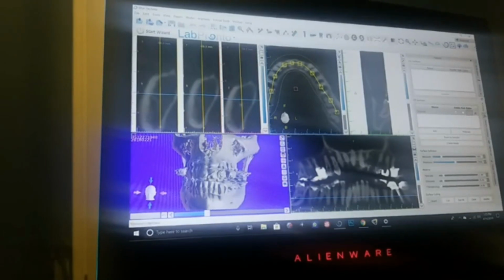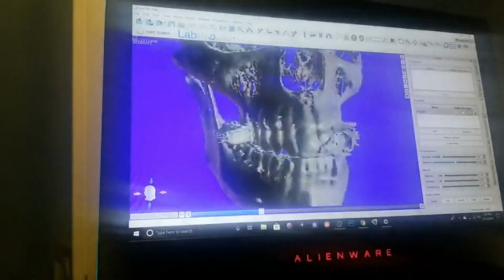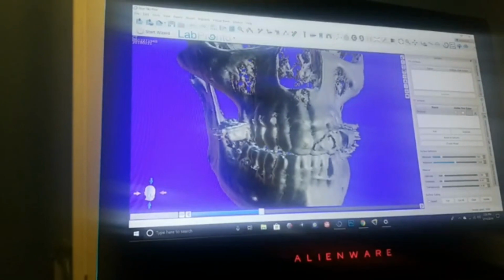Even though this looks like a 3D image, I can only look at this on a computer screen, and the computer screen is 2D regardless of what I try to do. So now you understand, it's a 3D process, but it's working on a 2D projection. Is that clear?